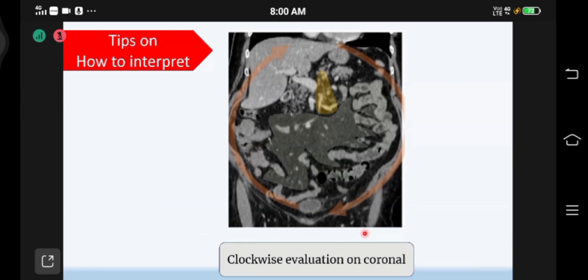Okay, that's all about theory. Now let's look practically, how the images are in front of each one of you, how do you start eyeballing it? How do you start interpreting? Because the abdomen is a Pandora's box. It just opens up so many structures, like in a coronal image, I see so many structures coming from the diaphragm down to the pelvis. So how to interpret?